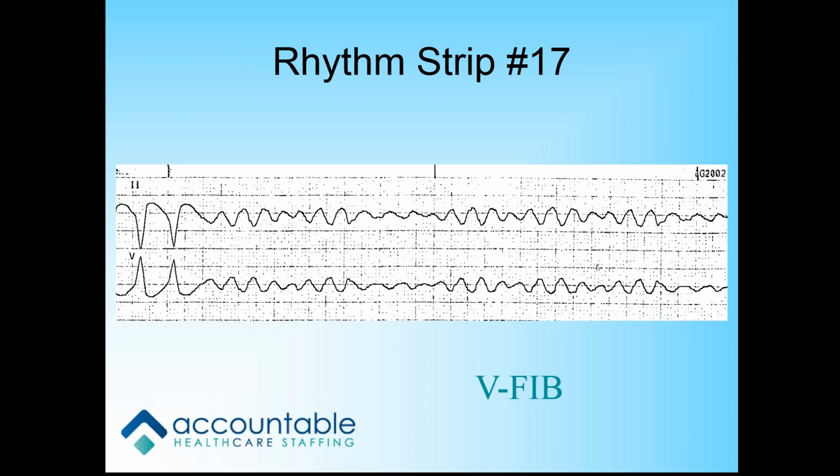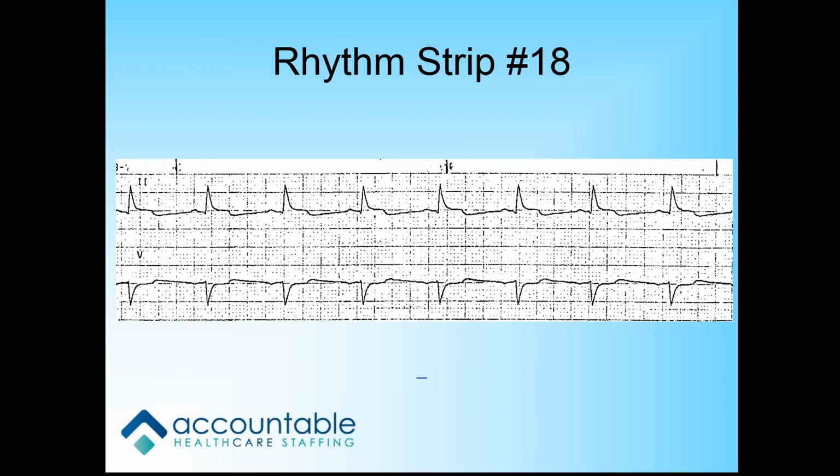Okay, Crystal. Excellent. Good job. You're ready for the lethal rhythm. Okay, Irene. Next. Oh, this one's perfect for you. You want to talk us through this rhythm?